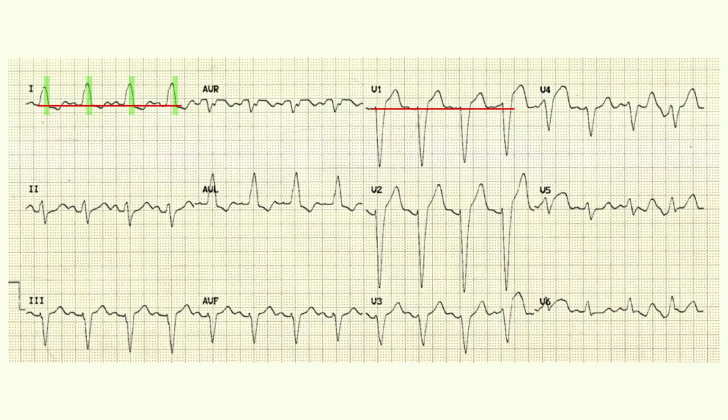And in V1, the terminal QRS is positive or negative? Negative. A big part of the QRS is all still negative, so that's going away from the right, so it's going to the left. So the last thing to depolarize is the left. See the same thing in AVL, see the same thing in V6. That must have been left bundle branch block.